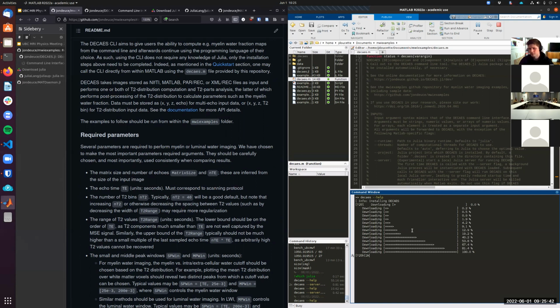Yeah, pardon these weird identifiers. I think that's just MATLAB doesn't like Unicode characters, and Julia loves them and prints them all the time. So that's a way to deal with.